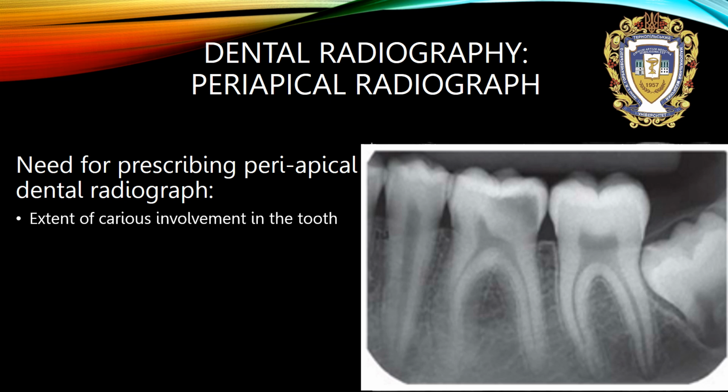A doctor sometimes cannot notice this caries during intraoral evaluation. But as you can see, the doctor can find it very easily on intraoral periapical radiography. Moreover, the caries on the opposite side.